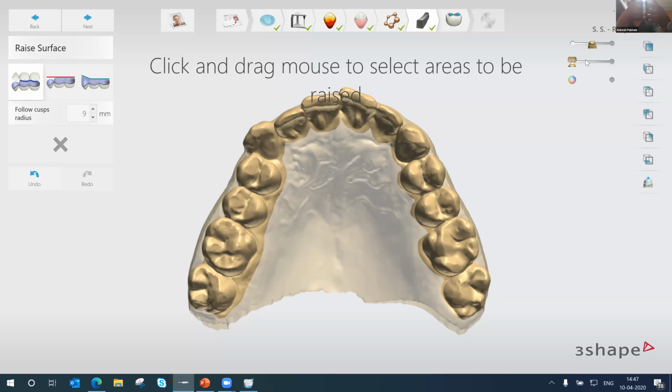So 3Shape has already done some R&Ds, like material testings on all the machines. So once they come up, they have come up with those settings as I showed you before. Those settings play an important role when you're choosing your output format. So it will be exactly as per your printer or machine that you're going to use. Those settings are defined, but to be very honest, if I'm an expert in CAM, I can still manage without selecting the machines as well.